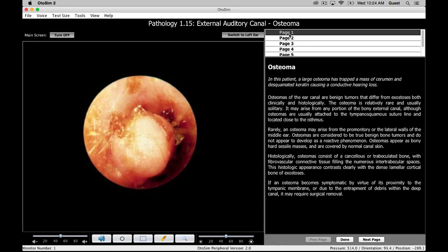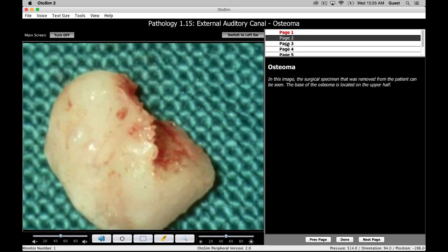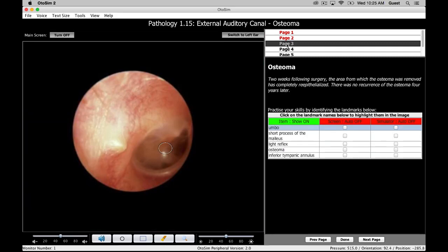There are many examples. If you want the next example, you go up to the top right of the screen and you get page 2. It gives you some pathology and some other instructional material as well. And then, as I mentioned, on any of the examples that we're choosing here, there is a screen that shows up. In this case, there's now a 3-part screen.